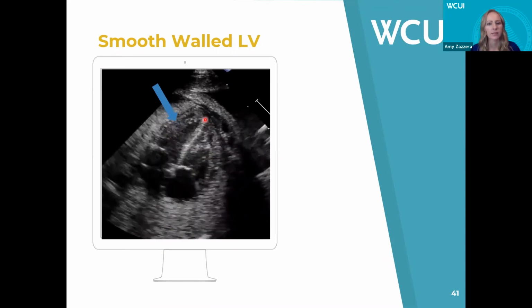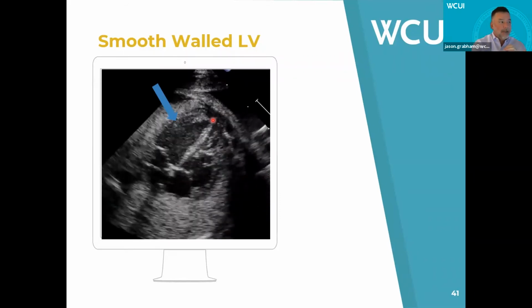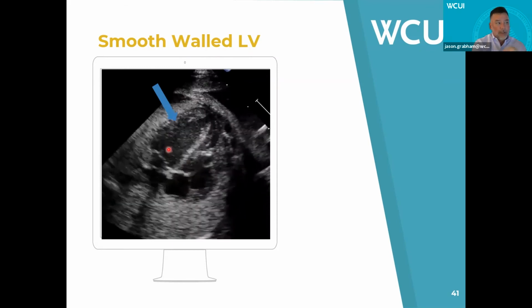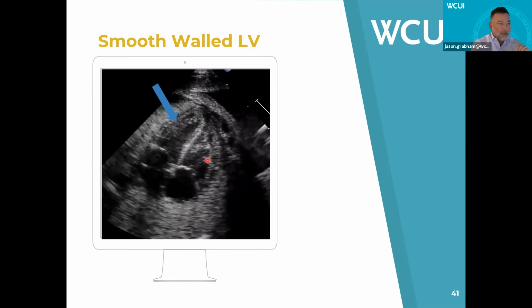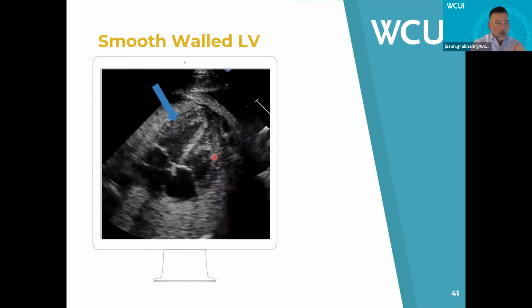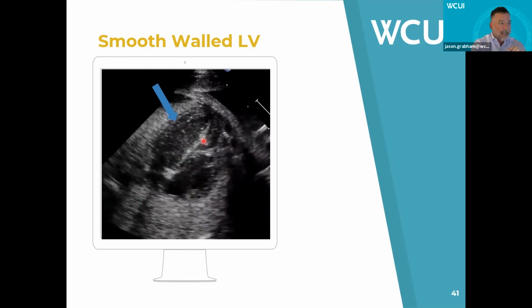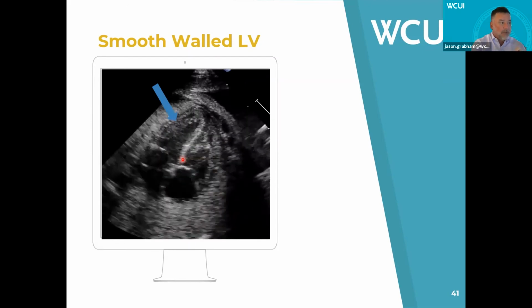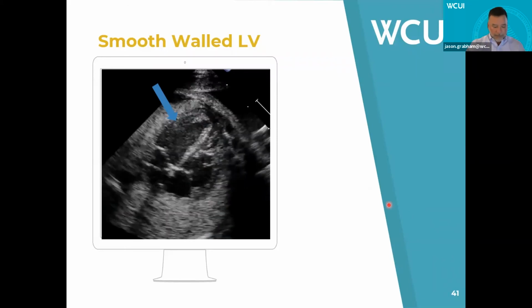The posterior wall of the left ventricle is trabeculated as well, but it's really fine trabeculation as opposed to over on the right, where you have a much more coarse trabecular muscle layout, much more of kind of muscle bundles in that RV. But one of the most characteristic distinguishing facts is the smooth septal configuration here on the left ventricular side.